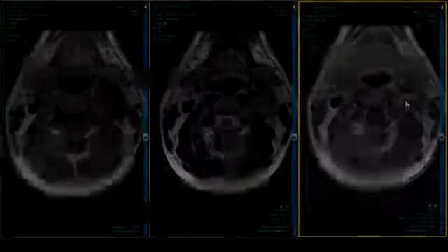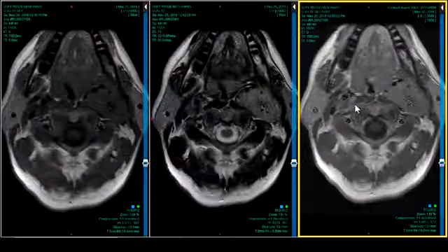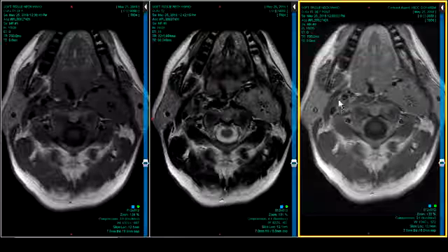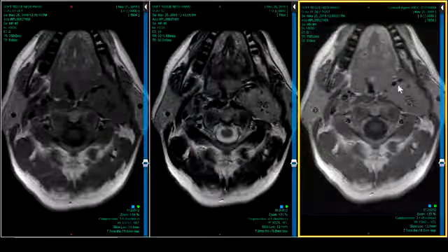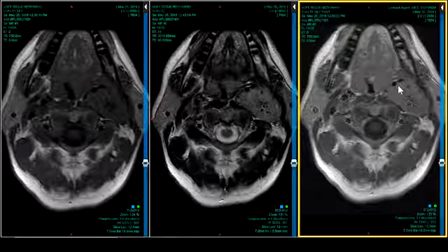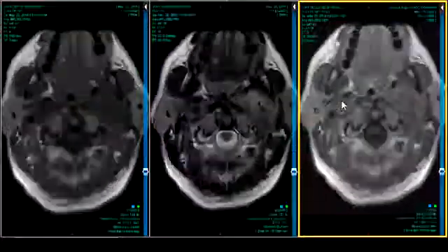because the carotid bifurcation is split, okay? So these two look the same because this thing's so huge, but they're two anatomically different things, because this is a carotid body at the carotid. We used to call it a chemodectoma, okay? And this is a Glomus vagale, so you can tell that by the location related to the skull base, a little higher, 2 centimeters down, pushing the vessels forward. And this one splitting the bifurcation is kind of a classic.